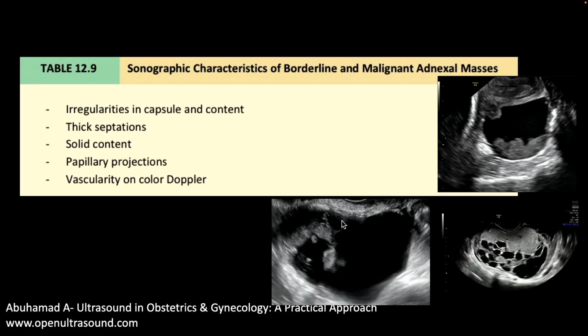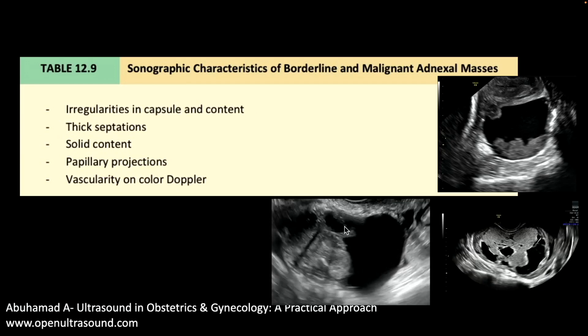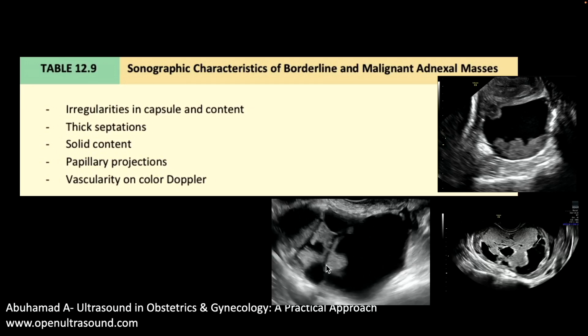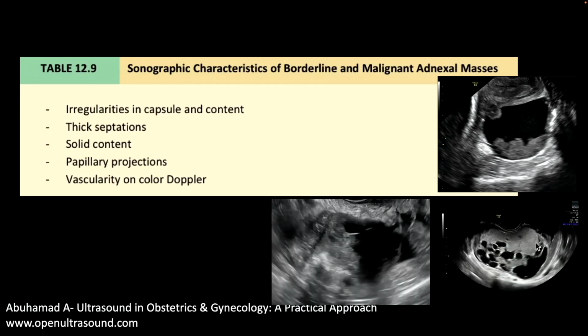Again, if you see right here, there's irregular borders to this. There are multiple foci, and this was a borderline tumor. So was this one.